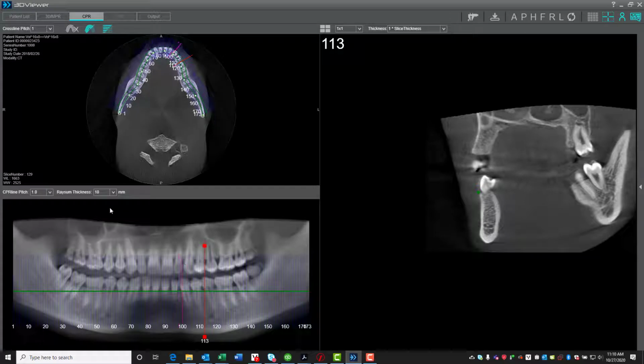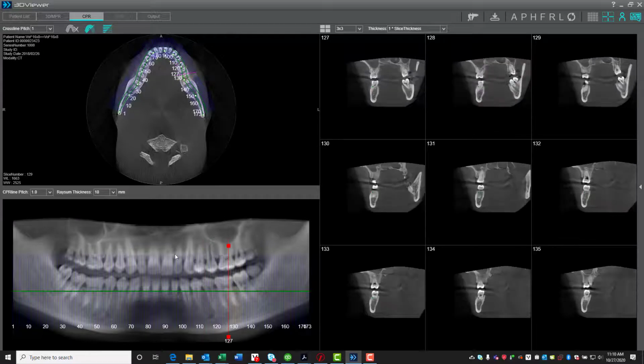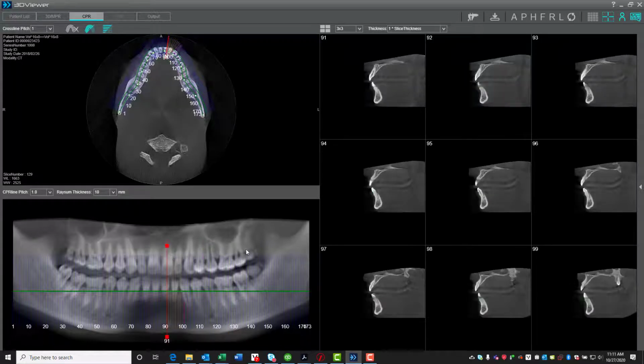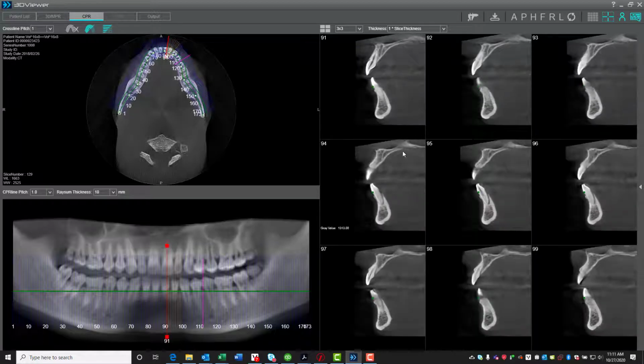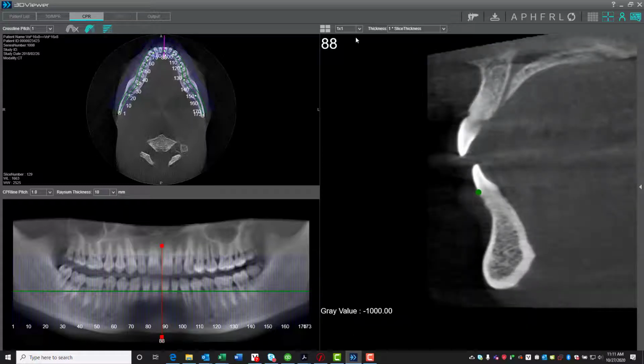An additional note about configuring the view of the cross-sectional view, some dental professionals prefer to see a framed view showing many slices along the arch. This can also be easily configured depending on how many slices you would like to see. In addition, making adjustments to the view in any one of those frames, perhaps zooming in, will make the same adjustment to all the frames.